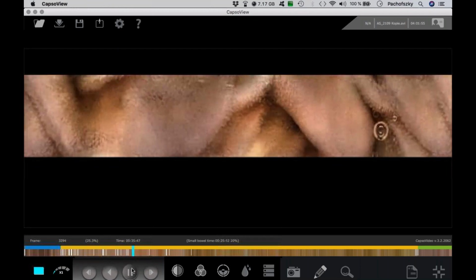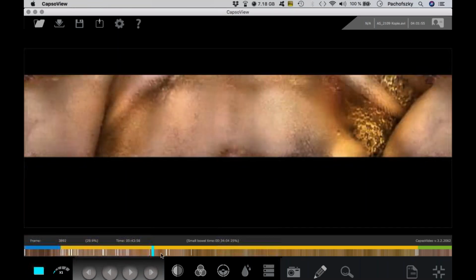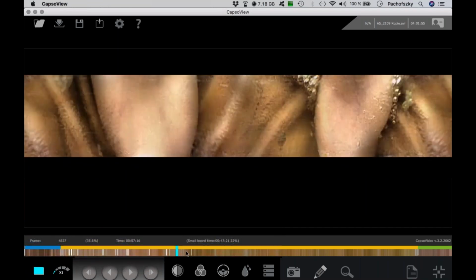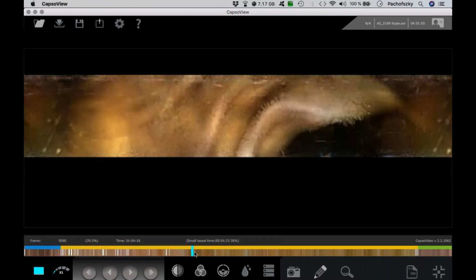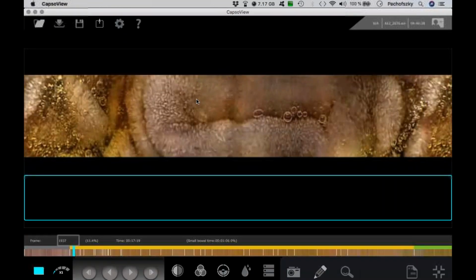In this case, I will stop and then we will go on with another case. I can't find it at the moment, but it doesn't matter. So we've seen a tumor, and we will go on with the next case. You can see I've prepared it.